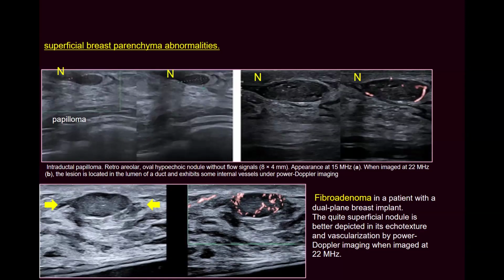I brought this example to clarify things. As you know, and as we mentioned before, the mammary zone is coning to enter the nipple areolar complex. So close to the nipple, we still have mammary zone up to the nipple areolar complex. We have ducts entering the nipple.